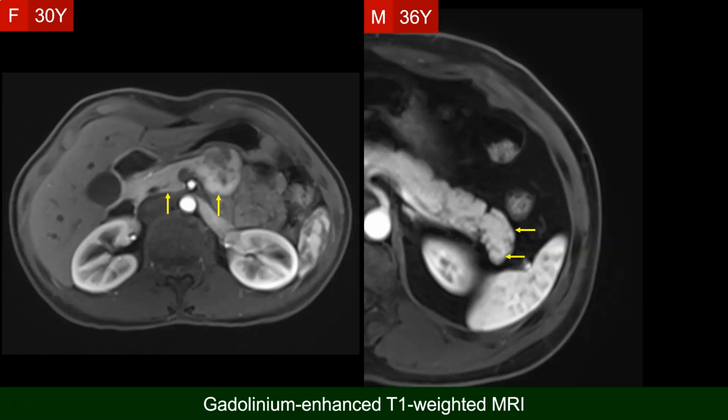Iodine contrast agent, on the other hand, has nothing to do with these two factors. Whether moving or not, iodine will have the same density, and higher concentration of iodine absolutely means higher attenuation value without any paradoxical effect.